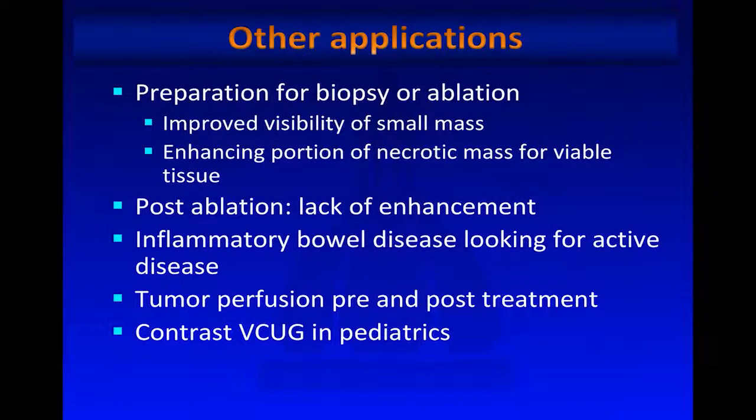Now, there are other applications in preparation for biopsy or ablation. Contrast is helpful in improving visibility of small masses, or allows you to target specifically the enhancing portion of a necrotic mass to make sure you have viable tissue. It's also useful when you do ablation. You want to make sure there is lack of enhancement at the end of your procedure.